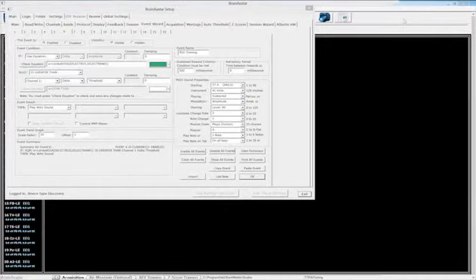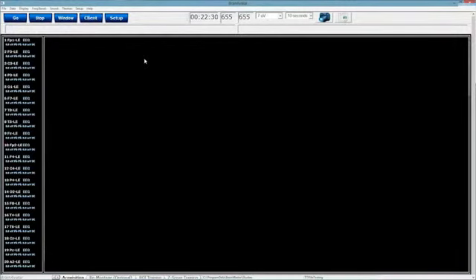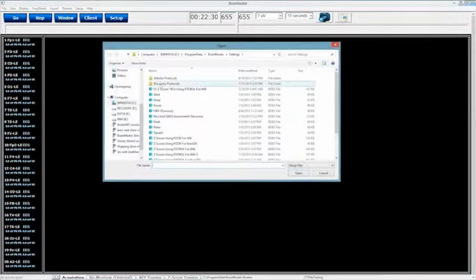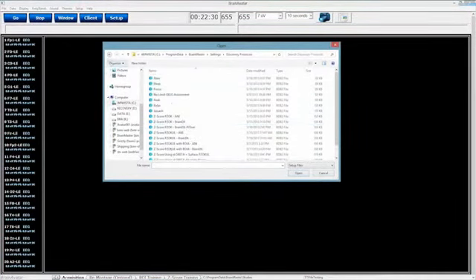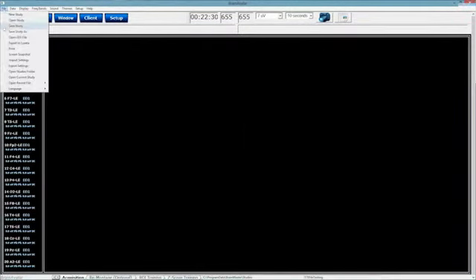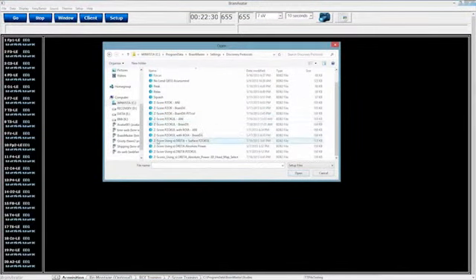As I said, the nice thing about the Event Wizard is that it really gives you flexibility on what you can do. As opposed to having the answer of no, I can't do it, the answer is yes, I can. I have the capabilities. I just have to figure out what exactly I want to do. There is one protocol in the software that really fits that, and I'm going to repeat myself right here: File, Import Settings, Discovery Protocols.